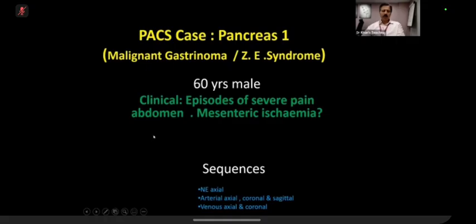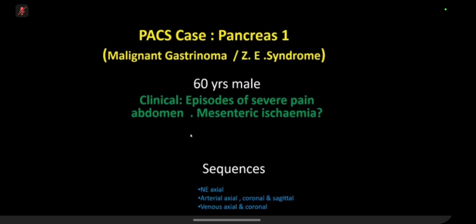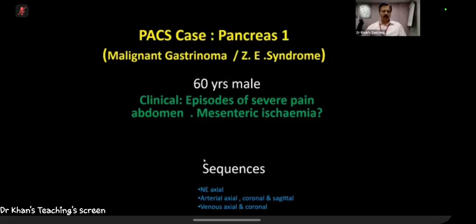Now, candidate 9, can you see my screen as in PACS case pancreas 1? Candidate 9, are you with us? Yes. So can you see my screen, 60-year-old male?